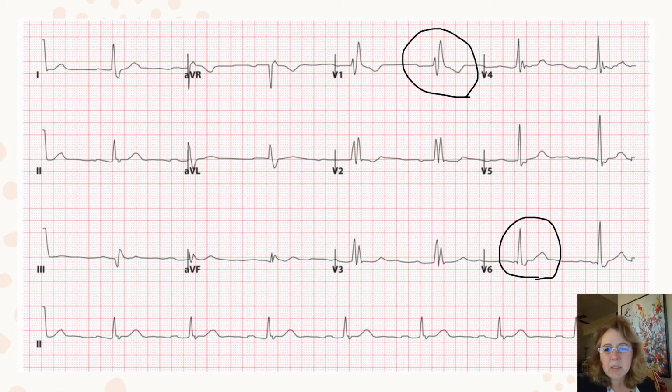So I would say it's mostly right around normal. It's probably a normal axis. Maybe it's sitting on the edge of left axis deviation. So possibly it's a left axis deviation, but now the question is, is that pathologic or physiologic? Because lead 2 is positive, it becomes a physiologic left axis deviation, and it's just barely one if there is one. Okay, so we have our axis.